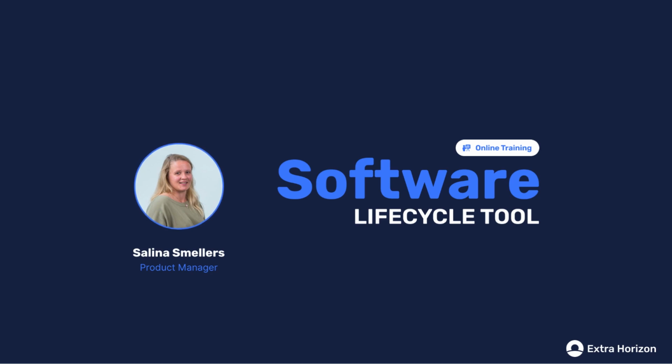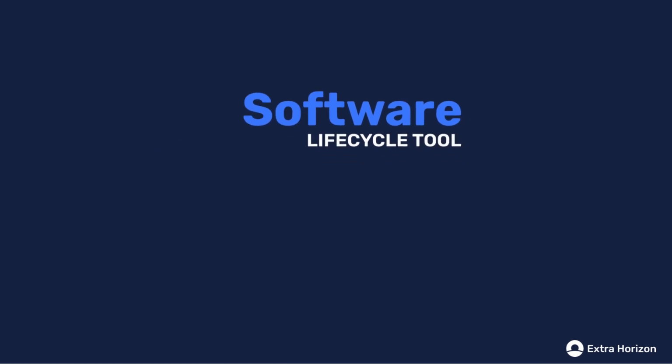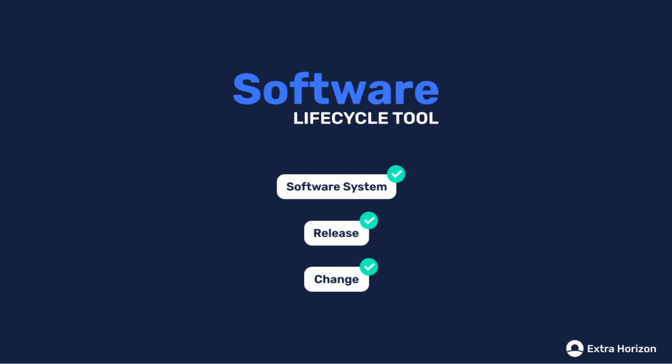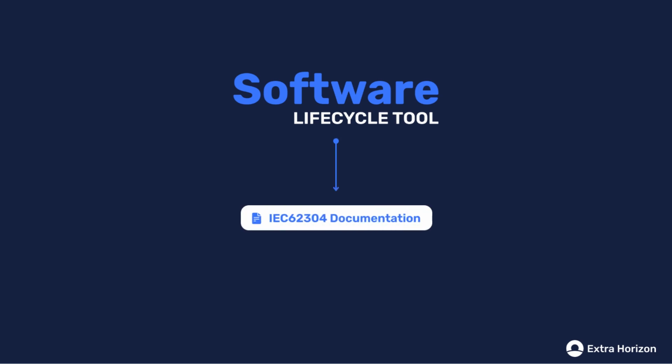We'll start with the core concepts of the Software Lifecycle Tool, after which we'll dive right into the tool to show you how you can create your first software system, a release and a change. Once we've added all the core components to our change, we're going to look at how you can verify it and make sure that it can be added to a new release of your software system. And then finally, we'll show you how the Software Lifecycle Tool generates 62304 compliant documentation, which can then be added to your QMS.